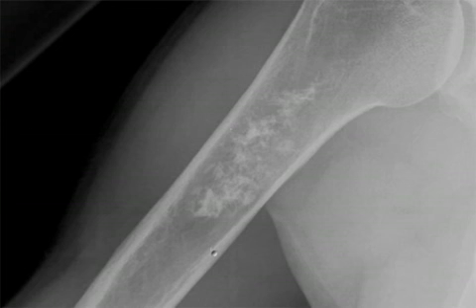MR imaging can be helpful to further determine the length of the lesion up and down the medullary cavity that may not be visible with plain radiography. But generally, when one sees this type of a calcific matrix in a medullary region of the bone, it's most commonly an enchondroma.